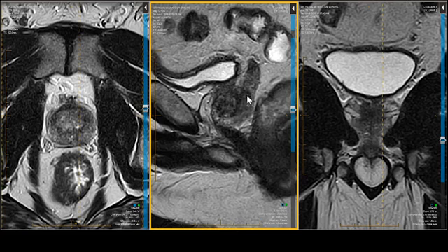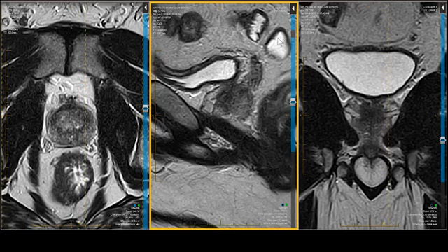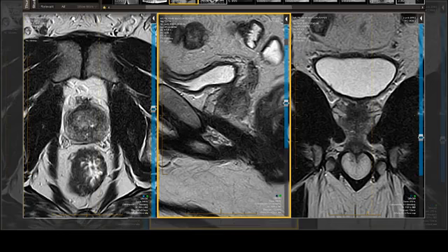But as we go off to the side, now we start to hit a lighter signal that makes a J shape. As we pointed out earlier, there it is. I'm going to take an even more peripheral cut, and I'm just going to color the PZ in for you. This is all PZ right here. This is PZ, peripheral zone. This is PZA and apical too. Anterior and low, apical. This would be PZP and also closer to the base. PZP, posterior, and base. And this is your central region, which is mostly now transitional zone off to the side.